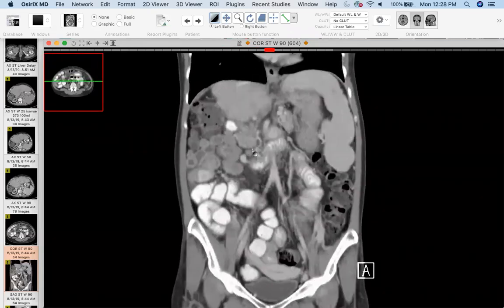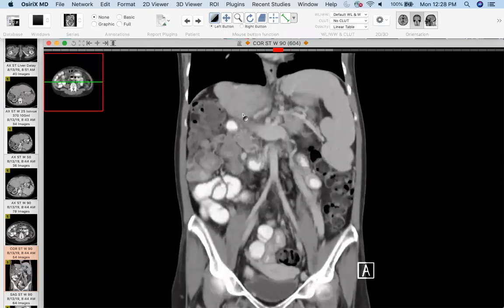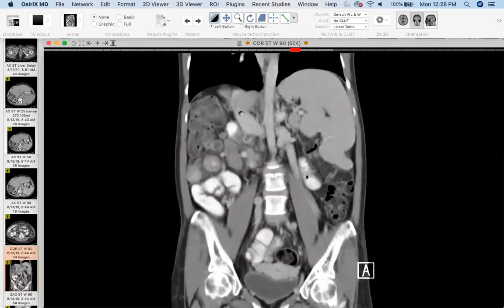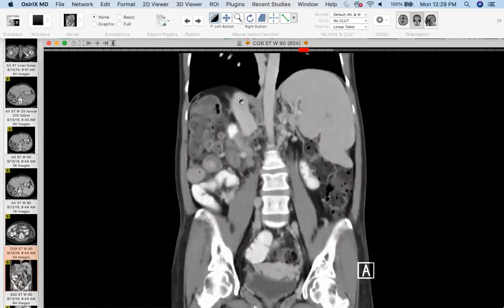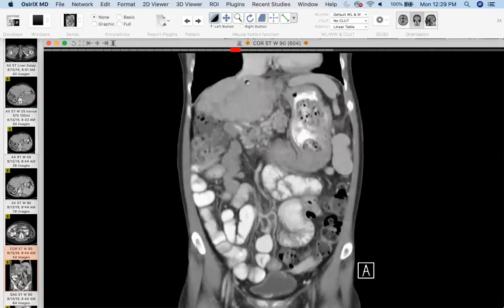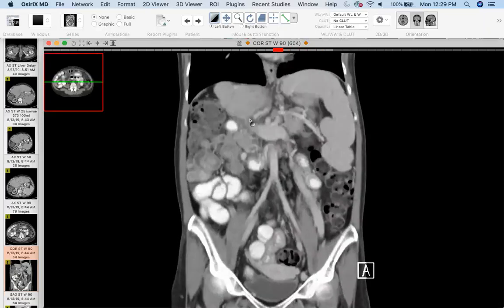Oh wow. But then this one is, the IVC just draining into the main portal vein? Oh my goodness. No, it's here. It keeps going up. So that's the hepatic. I mean, that's the IVC, right? Up here. And then that drains into the heart right there. Okay, so you're right. Where's the right IVC?